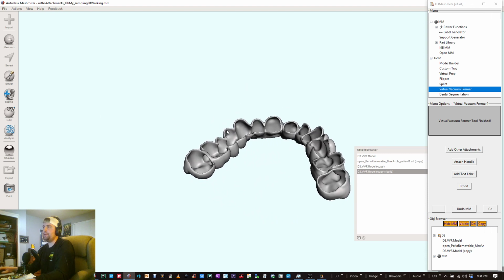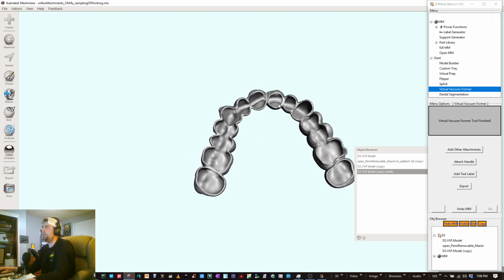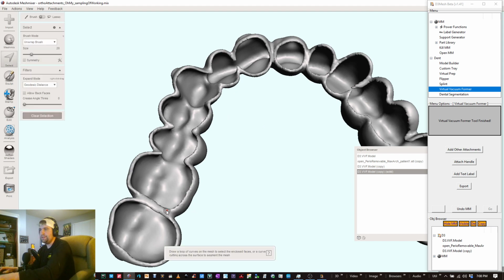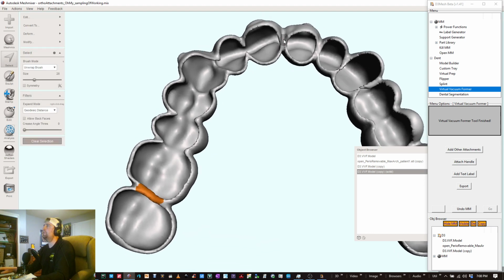So what I was trying to avoid was these bridges, like right here, right there, right there, here, all those. So this still isn't like the end of the world. I can just hit the select button and just kind of select that part and select this part and select this part, that part, and that part.